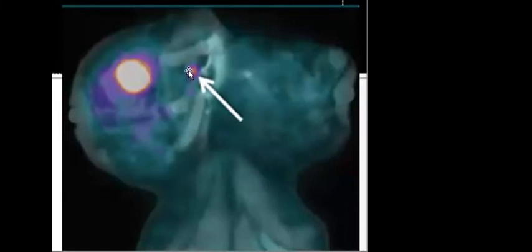So it's important for you to check for the internal mammary, plus the supraclavicular, plus the mid and lower axillary region lymph nodes. Okay? So in this case, check for the complete ring and don't forget the small metastasis in the internal mammary.